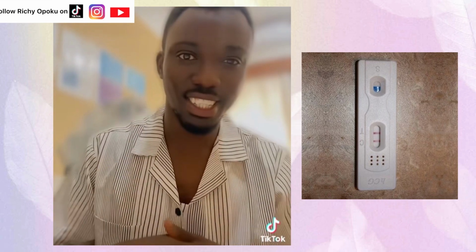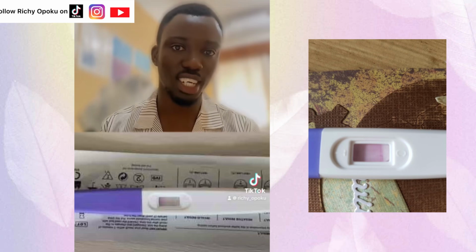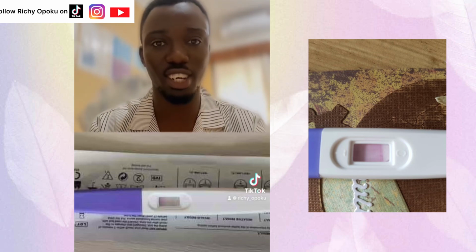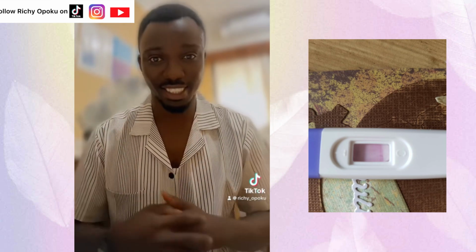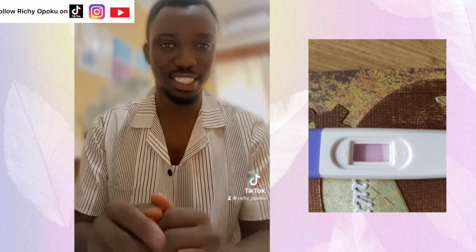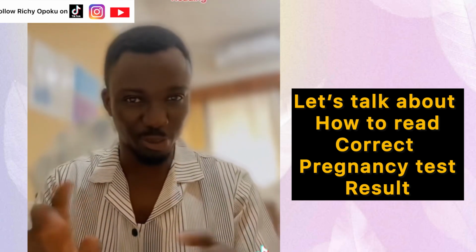So this lady did a pregnancy test and she had this result. That is the picture down there. She was confused because there was no line on the cassette. So she sent me the picture and asked me, Richie, does it mean I'm not pregnant? That was the question, because there was no line on the cassette. What do you think? Now, let's talk about pregnancy test results, how to test and how to read the results.